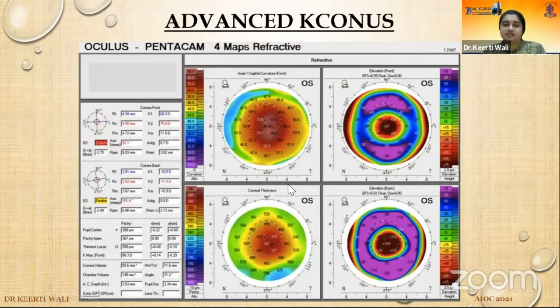This is a very straightforward map of advanced keratoconus that anyone can understand. The keratometric values are pretty high, 68.3 and 75 diopters, with a hotspot on the curvature map. And the elevation points are at +97, +65, very high. Posteriorly it is +169, very high values. And the thinnest location is 359 microns. But the X and Y coordinates are normal here. So this shows a central advanced cone. So this is an advanced keratoconus.